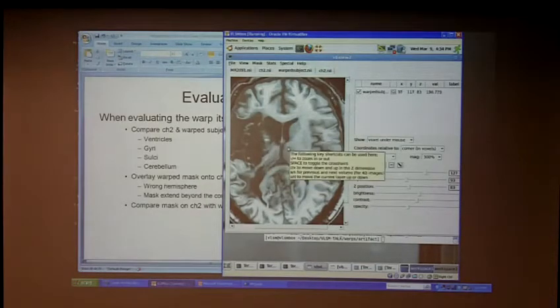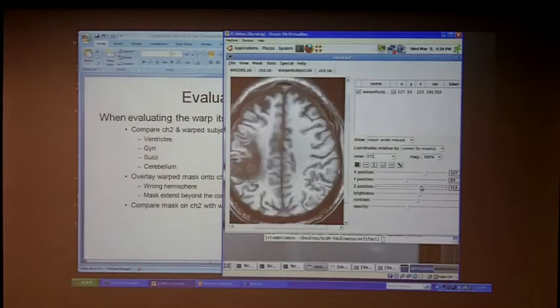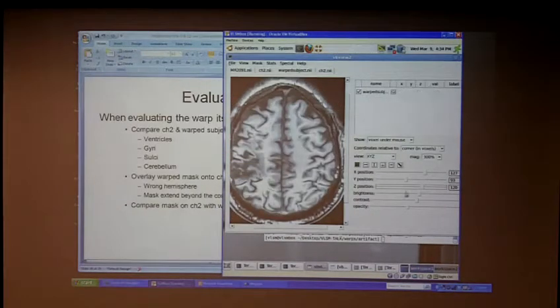Obviously, I think we've talked about the higher points on this brain, especially up in here, we could definitely do some improvements. But we think that this is going to be due to essentially the intermediate template and can be improved.